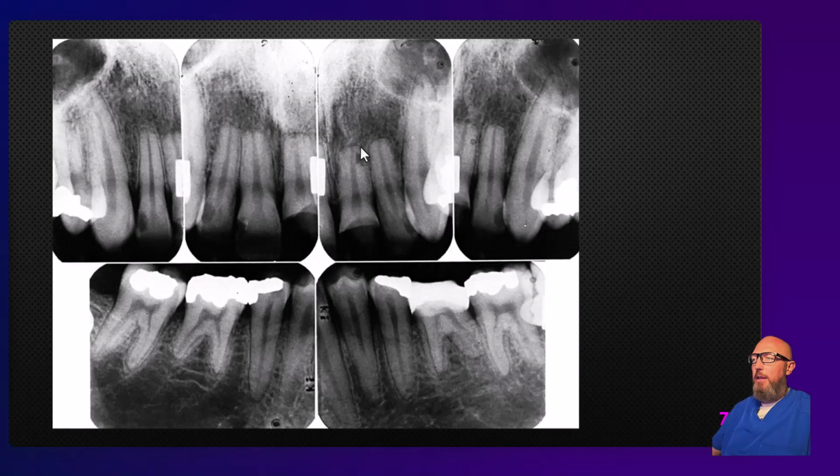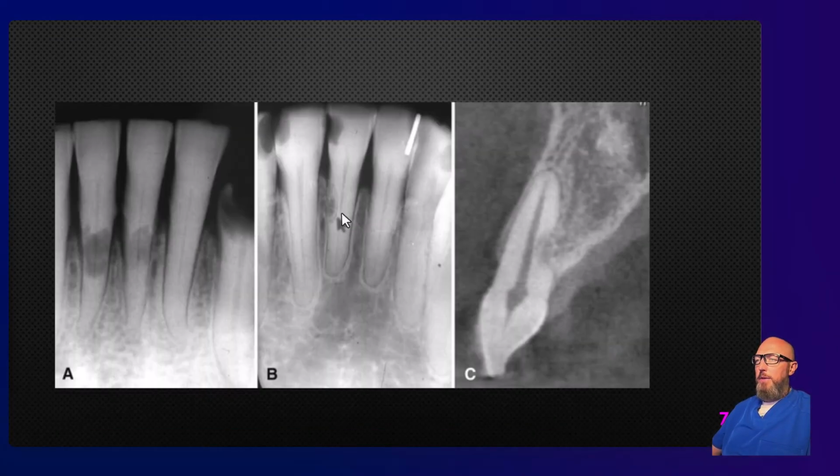But do you see any indication of periapical radiolucency? No, the PDL spaces are completely intact. Some other examples here, just very short-rooted. It just looks like short-rooted teeth, basically, when it's external apical resorption. All right, then what about here? This one's pretty easy to notice because it's on the distal surface of that tooth, and then you see the bone kind of growing in here, and you have intact normal PDL space.